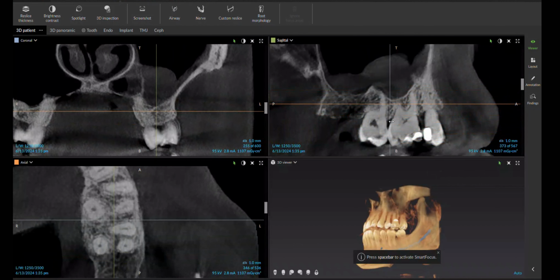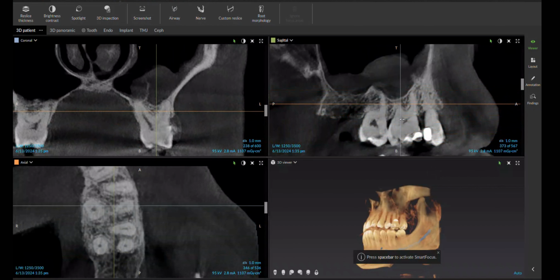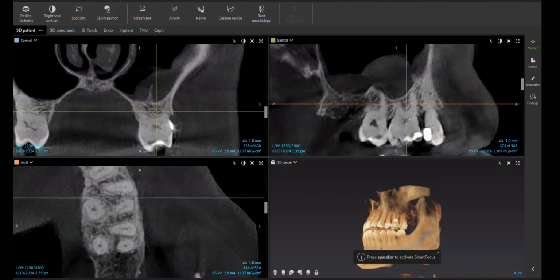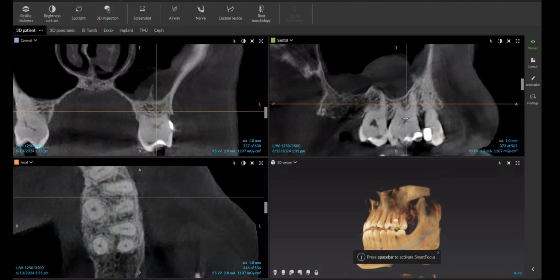I don't see anything on 15 other than the obvious sinus response to either something related to the sinus or the teeth themselves. When they're odontogenic in nature, so when the sinusitis happens as a result of a tooth problem, it tends to be more isolated and symmetrical around the tooth itself. Although this could be an advanced situation that has started to spread, this really speaks to me more of a chronic sinusitis or acute sinusitis issue that is of non-odontogenic origin.